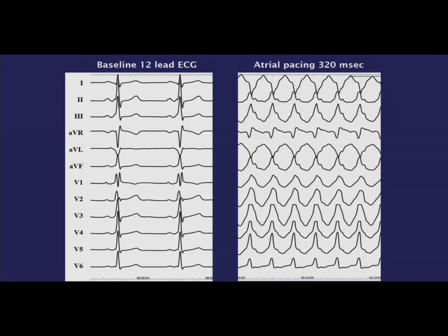And if you're negative in 2, what does that tell you? Broth, I know you know this. And if nobody else answers, I want to call on you. If you're negative in lead 2 with the surface EKG, with what appears to be an upright QRS complex delta wave in lead V1, anyone know? So that's a signature. Broth, want to help me out here?